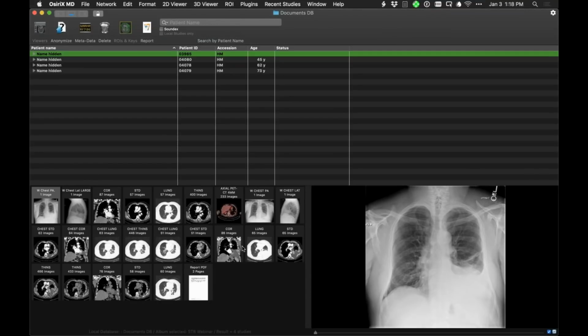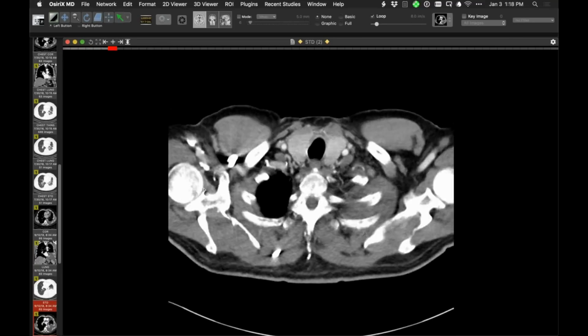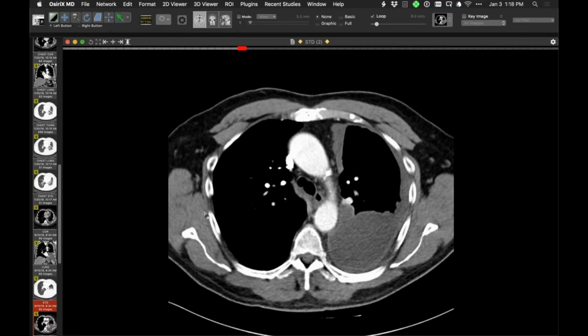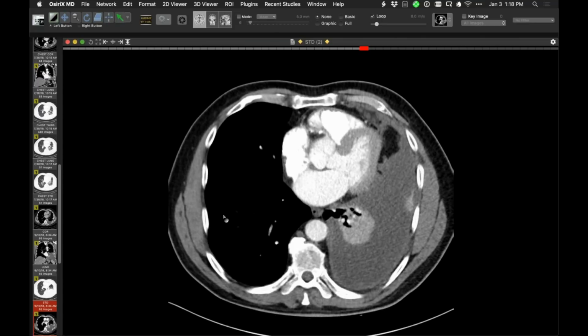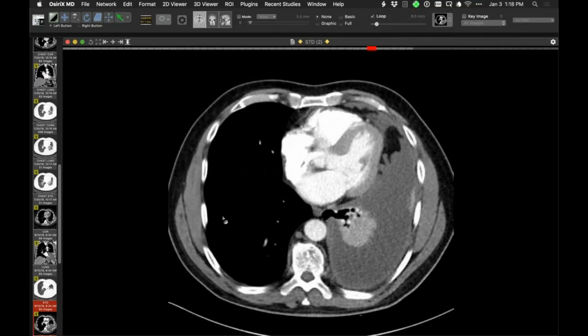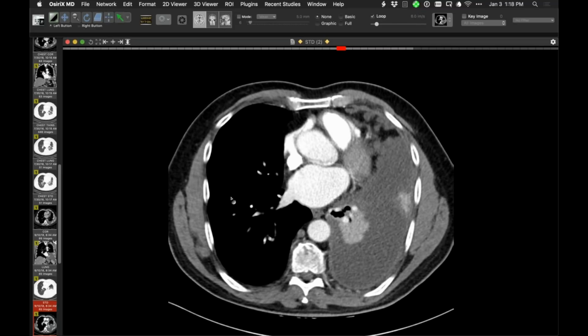So this is a case of a person that had a left pleural effusion for a rather prolonged period of time. And I'm going to show you a selected series during the course of the patient's initial illness. And as you might appreciate, people quite readily describe the presence of a persistent left pleural effusion.